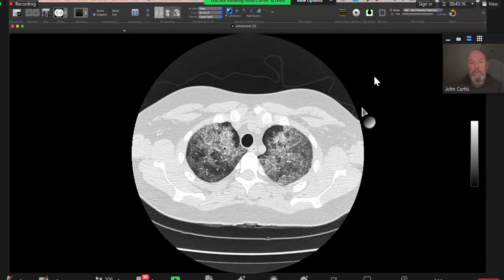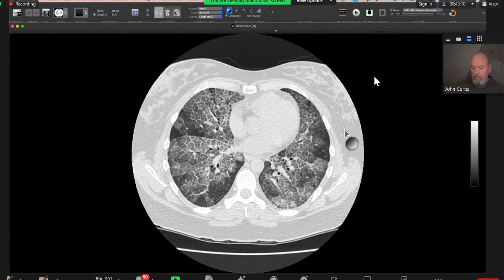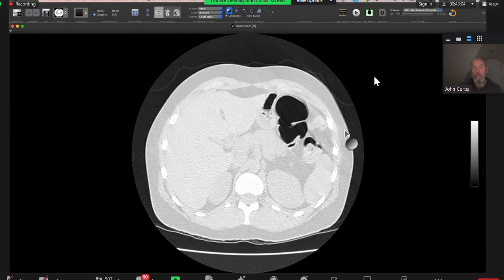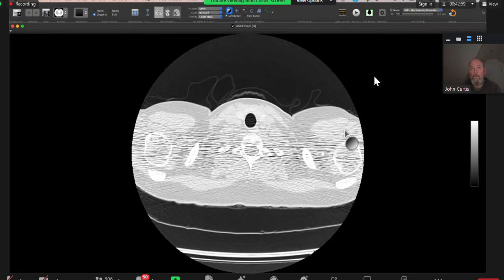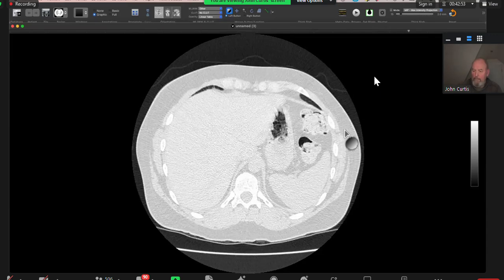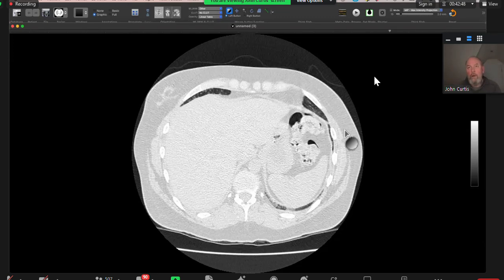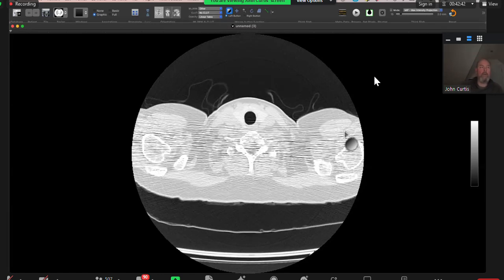This patient is breathless. Yes, I have been presented with axial images of chest CT scan. I can see that there is evidence of interlobular septal thickening associated with ground glass appearance, giving the appearance of crazy paving sign. I cannot see any pleural effusion, and there is no significant lymphadenopathy seen in the mediastinal or both hilar areas. Diagnosis? My first diagnosis is pulmonary alveolar proteinosis. Okay, good. Let me take control.